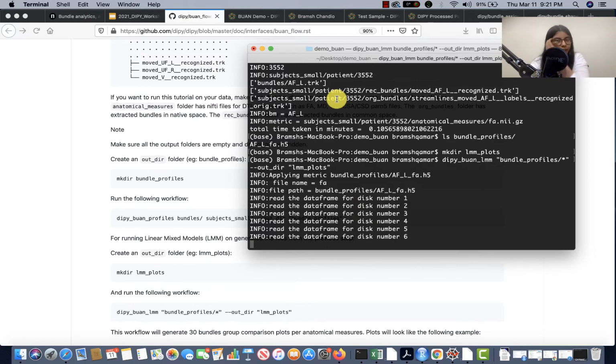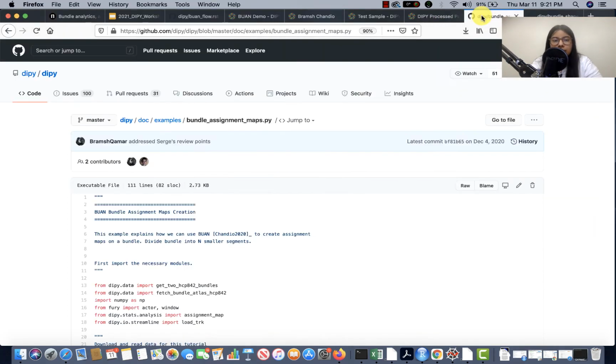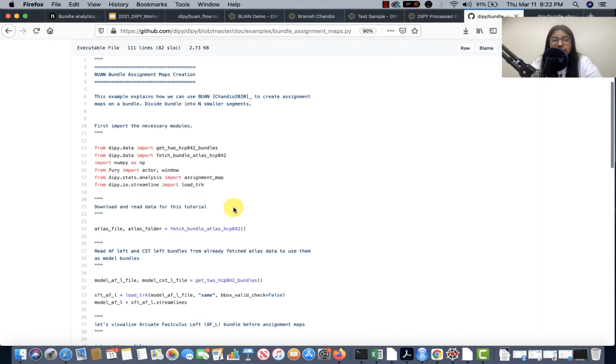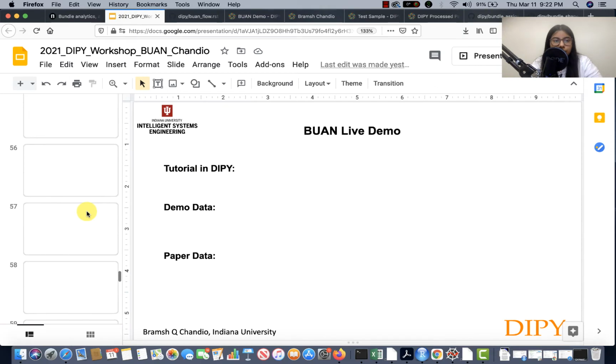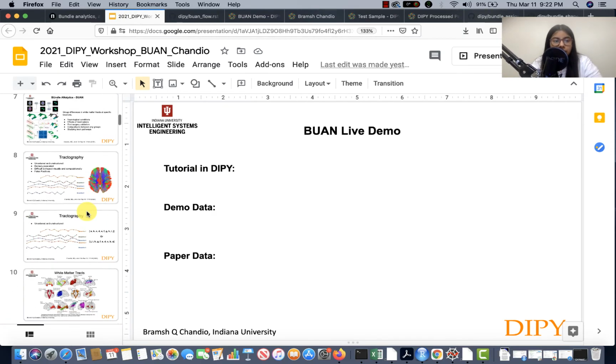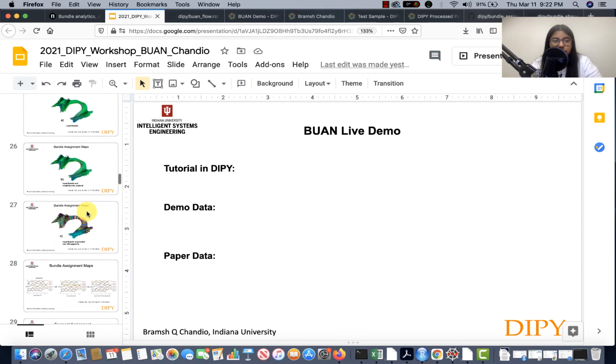So while it's running, let me show you some more tutorials on BUAN that are available in DIPY. So this is bundle assignment maps. For example, if you are interested in just creating those segments that I talked about before, let's go and see those here.